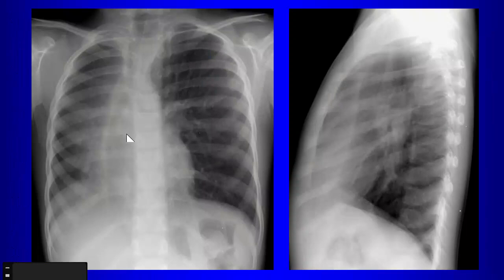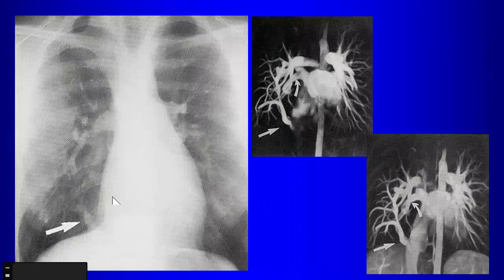Okay. Another example, small right lung, there's the vein, there's the scimitar vein. Okay. So if you see it, you might notice the small right lung, right? So if you notice a small right lung, something to look for. Look for that scimitar vein.